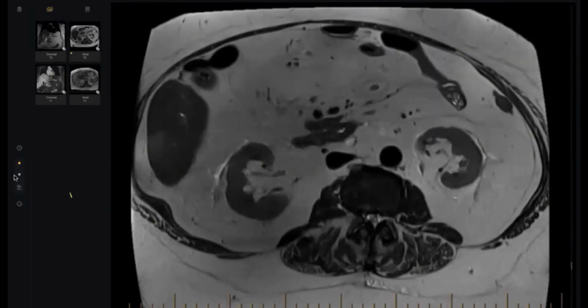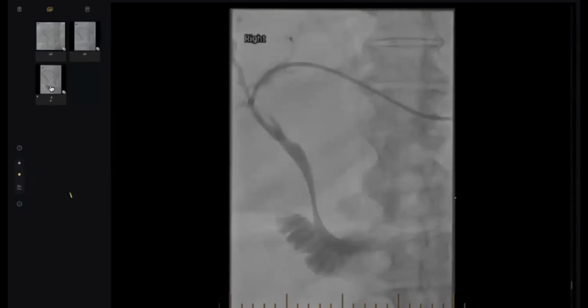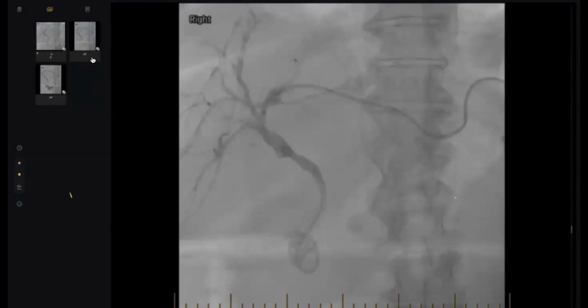ERCP is done here. Look, this is the ERCP, and they put a stent. This is the ERCP. This is PTC, I think, from the beginning. This is PTC. I think the catheter is from outside here. Yes, this is PTC. Okay. And I think there are.